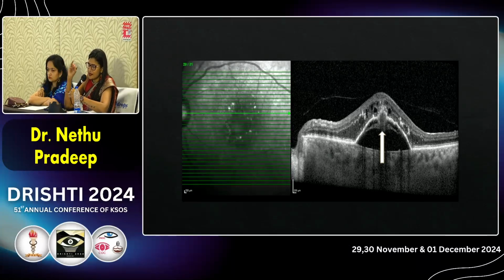So the presence of intraretinal hemorrhage without subretinal hemorrhages. Subretinal means that there is definitely a subretinal CNVM. So here there is intraretinal without a subretinal component at all. You can get intraretinal in CNVM. That's why I'm specifying that, because in a CNVM you can get both intraretinal and subretinal. But if you just get intraretinal without subretinal in what appears like a CNVM, then you have to suspect that it is a RAP.